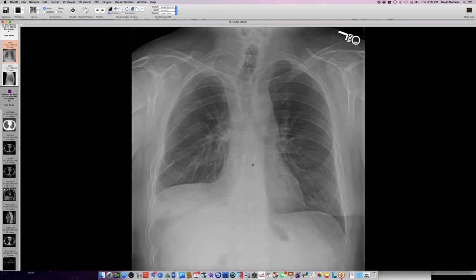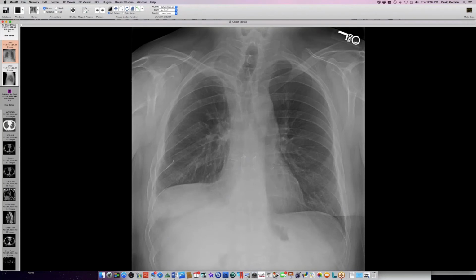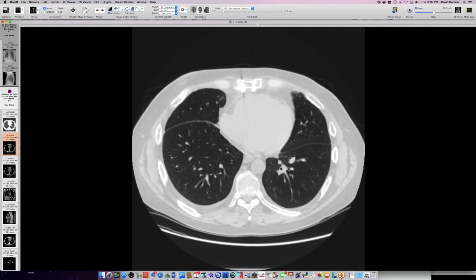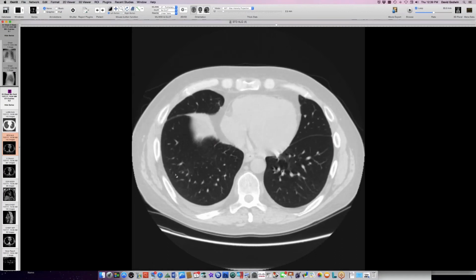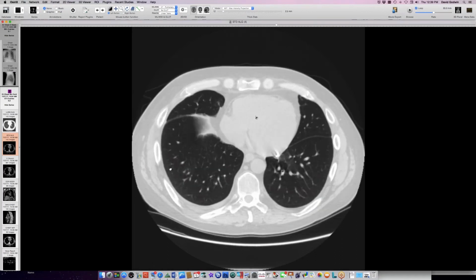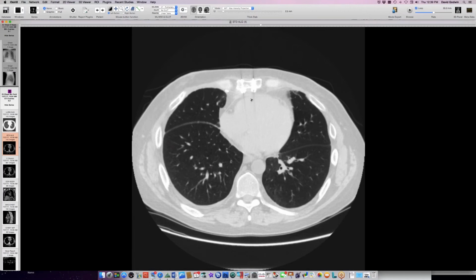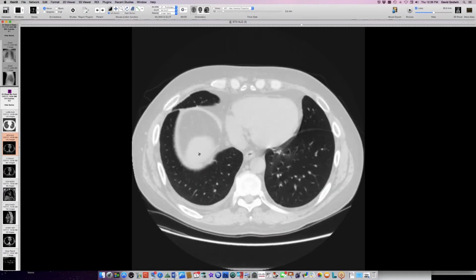So these sternotomy wires here have broken, and I believe one of them poked into the right ventricle, or yeah, at this level, probably right ventricle, not pulmonary artery, and then embolized to lung. So we should be able to find it here on CT. And here's our wire out here, sitting out here. So an embolized wire fragment here from fractured sternotomy wires, I think probably directly inoculated into right ventricle nearby, and then embolized to right lung.